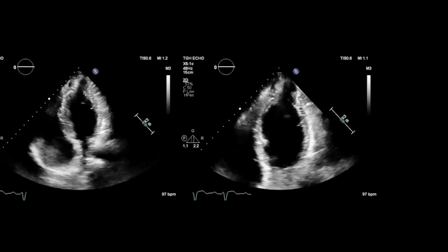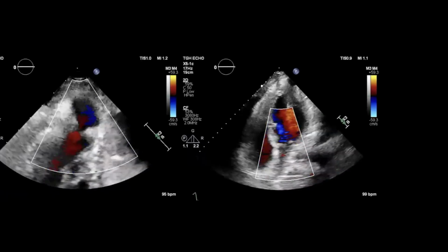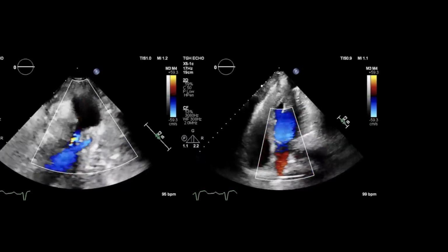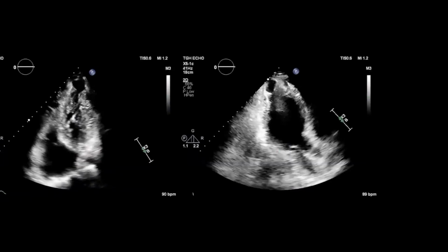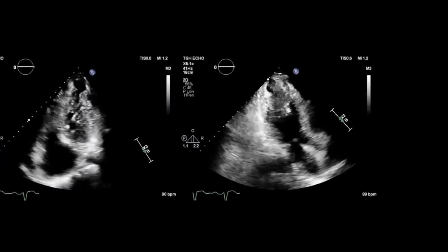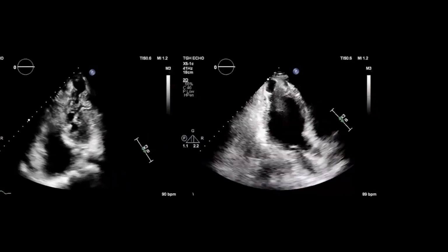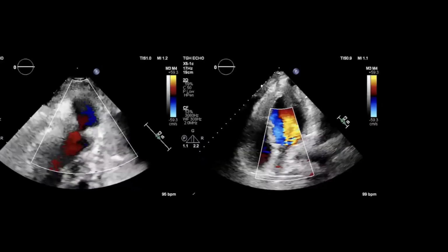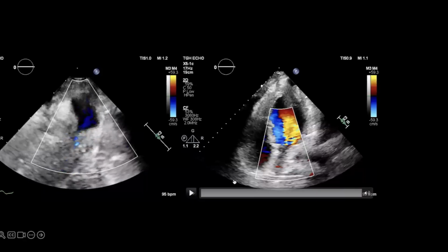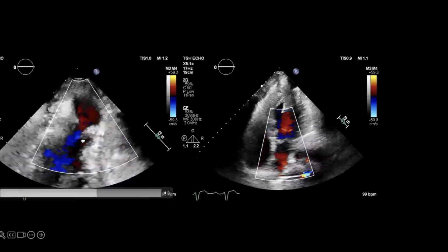Echo drops out. I'm going to go through things, and they put color across it. Any other thoughts? The same theme here. See how the color shows to and fro? Sometimes if you can't see the angles, you see that color to and fro, you should really look closer. You're saying right here? Yeah.